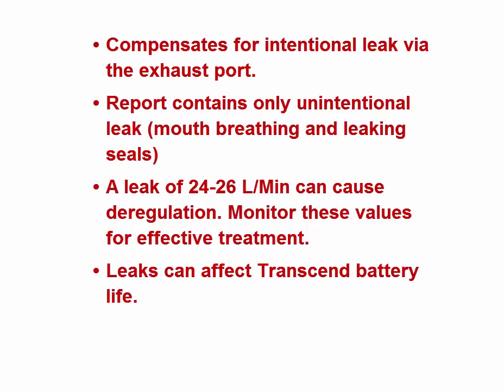Transcend automatically compensates for intentional leak via the exhaust port. This report contains only unintentional leak, such as mouth breathing and leaking seals. Most PAPs deregulate around a leak of 24 to 26 liters per minute, so monitoring these values is critical for effective treatment. And Transcend battery life can be affected by the amount of leak as well.